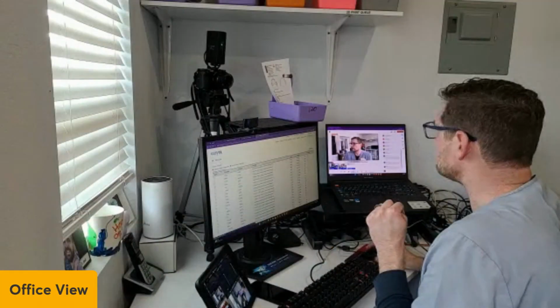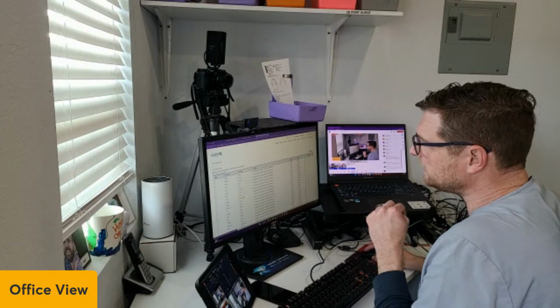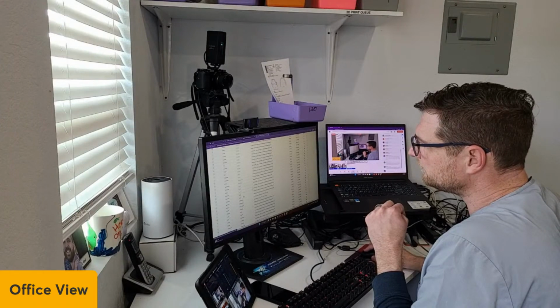Let me do my blurry thing real quick. I could actually show this screen probably. So I'm just going to blur the last names of all these kids. So this actually helps you find the kids. That way you don't have to worry about clicking on the wrong one and stuff like that. All right, so blurring all the names. Y'all get to see the behind the scenes. You see there's a whole bunch.